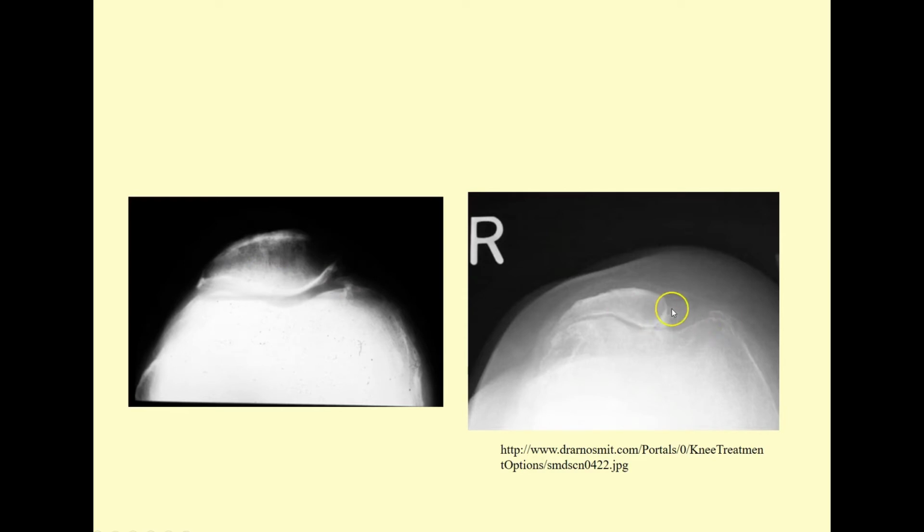Now look at this one. This is subluxated quite far to the lateral. And we also have it remodeled over the lateral femoral condyle. And we have evidence of a big cyst here in the lateral femoral condyle. So very much a classic case of patellofemoral DJD. It's even got the sawtooth or tooth appearance on the anterior margin, as does this one. But lateral migration and remodeling, making this a particularly serious presentation.